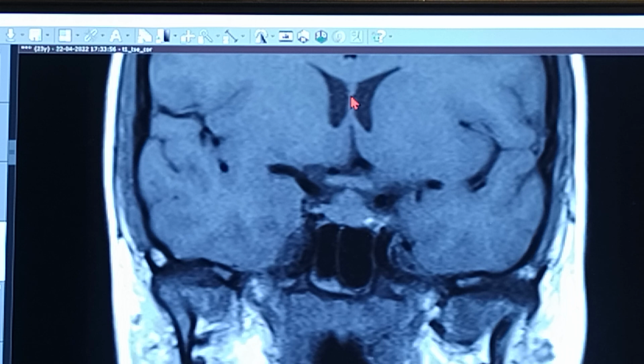Look nowhere else, you will get confused, because there is one more point of differentiating T1 and T2 just on the basis of the cortex and the parenchyma. That is the gray matter and the white matter of the brain. That is really confusing.